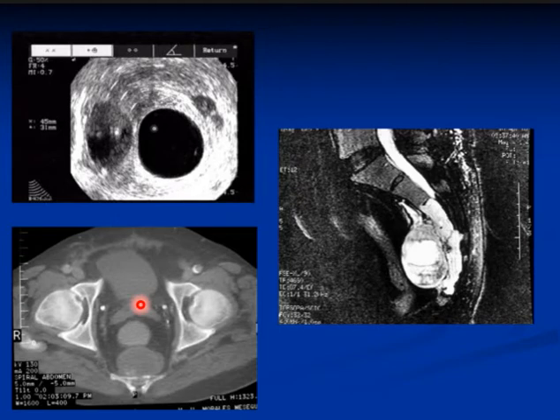Now, let's go to the CT scan. On the selected image of the pelvis, pelvic CT with IV contrast shows a well-defined presacral mass. Associated with mild fat infiltration? I don't think there is fat infiltration here. The fat looks good. There is no bone erosion, but I think.